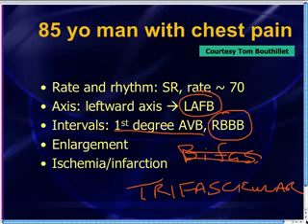What's the significance of that? Well, the significance is very simple. It means that the patient has a higher risk of ending up needing a pacer. They have a higher risk of going on to develop complete heart block, especially if it is occurring in the acute setting. Anyway, where are we now? Sinus rhythm with a trifascicular block, rate of 70.